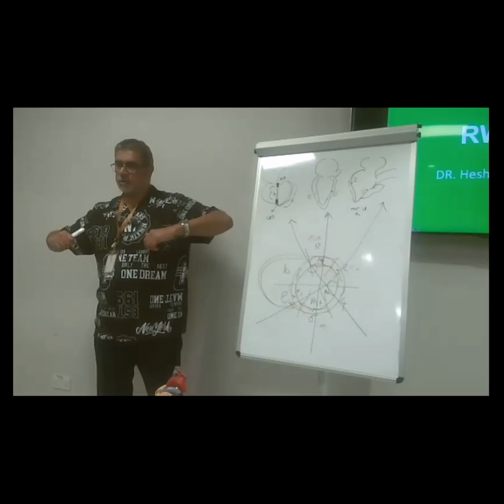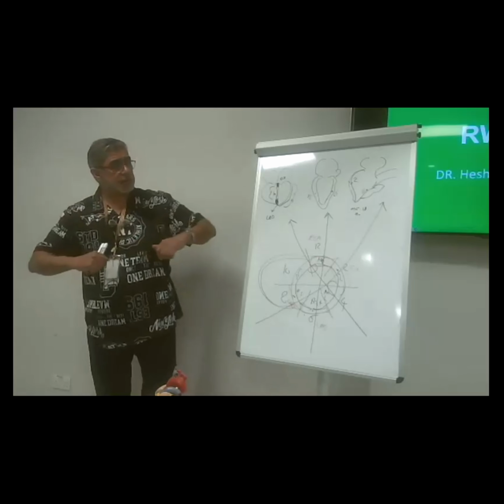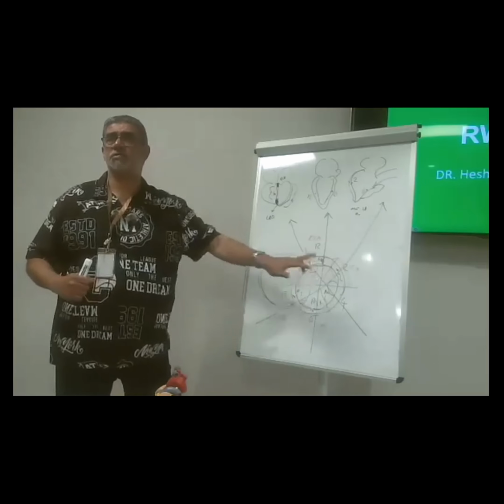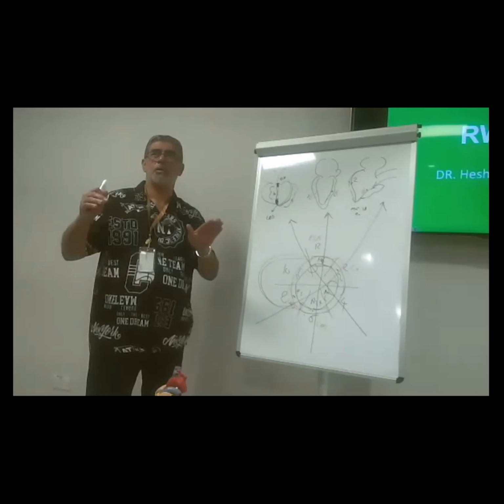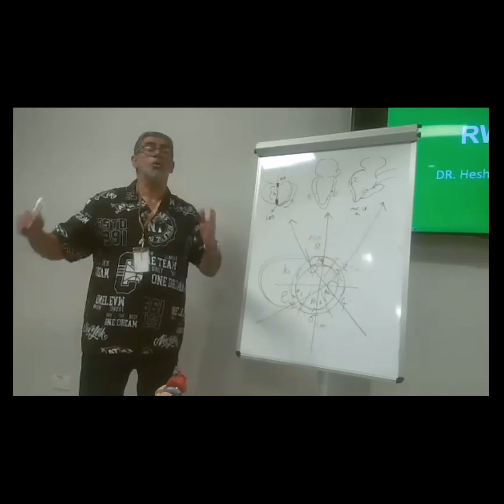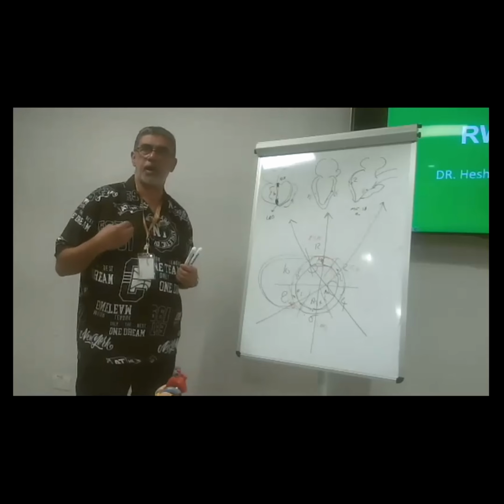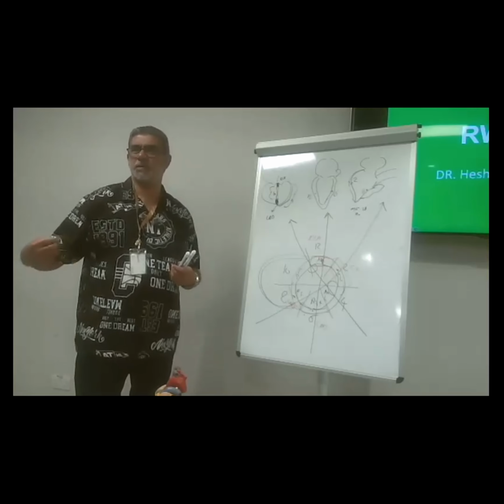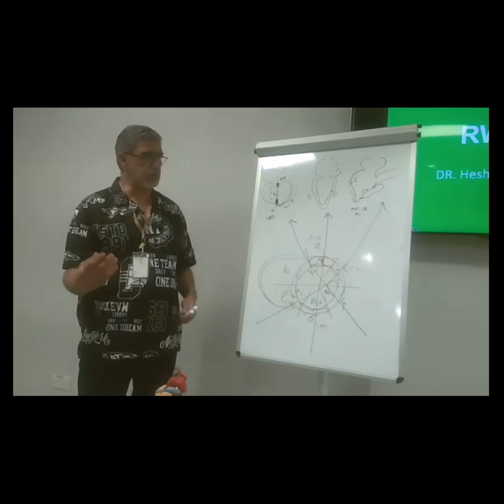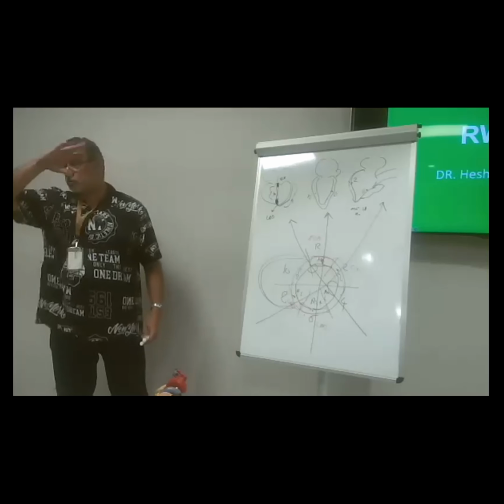Sometimes the circ is dominating, sometimes the RCA is dominating. In this area usually the circ is dominating. Don't bother yourself with this. But if I am allowed to express non-scientifically, I will tell you this is pure CX.